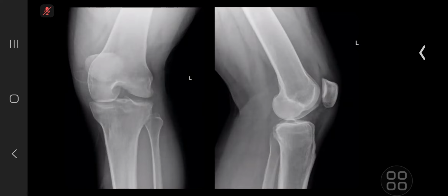Okay. Any other? What is your next step? You will only refer this patient to orthopedic surgeon, and then. Well, I think it might be useful to have radiographs of the right knee to compare whether this is a symmetrical process or this is focal.